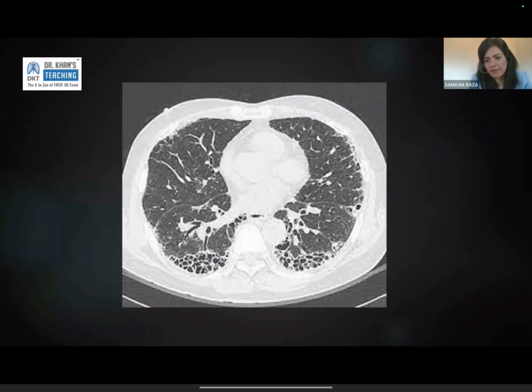What is bronchiolectasis? Bronchiolectasis is the end airway dilating all the way up to the pleural surface. And how can we tell bronchiolectasis versus bronchiectasis? Bronchiectasis is a primary abnormality of the bronchus. Bronchiolectasis is only seen when it's fibrotic lung disease, because the end airway doesn't really have that much muscle in it that will have primary bronchiectasis. So when the end airway dilates all the way, it's almost always because of fibrosis.